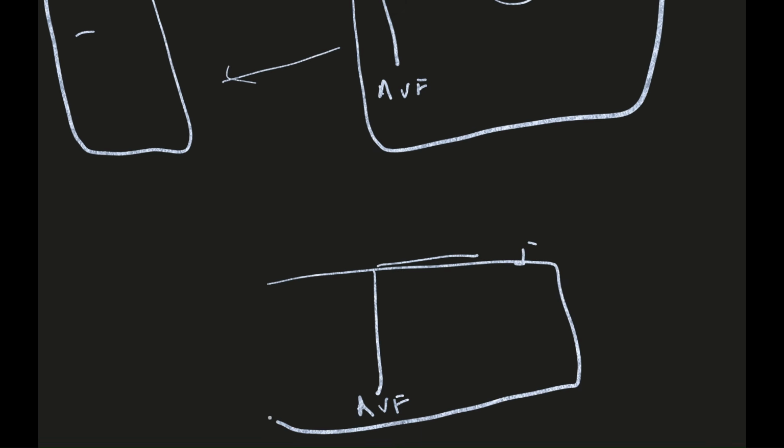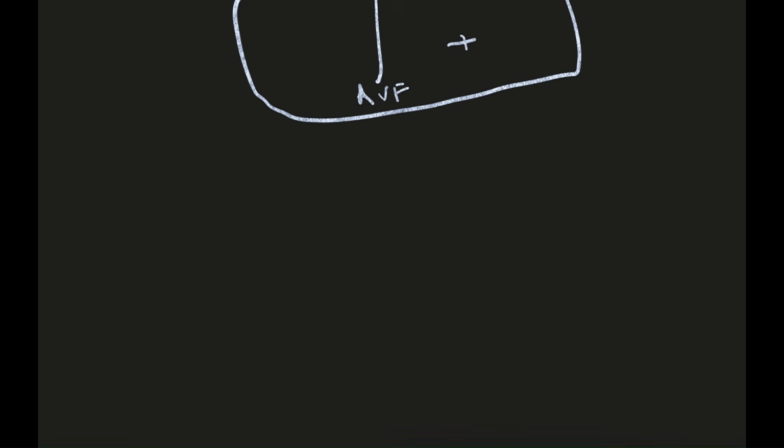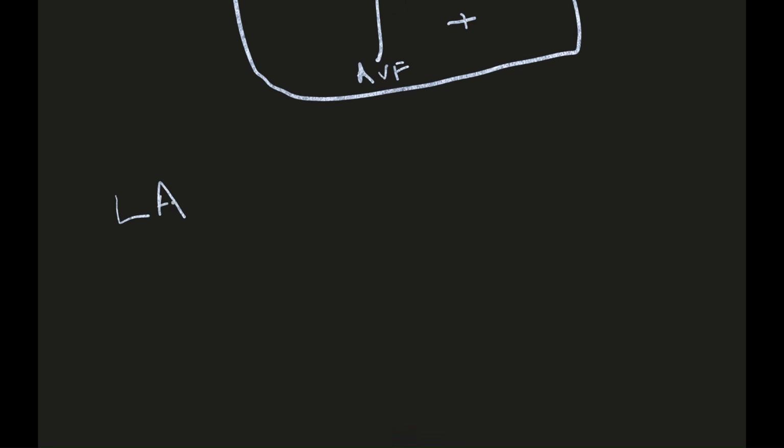This area of AVF is positive. However, this area of AVF is negative. What happens in left axis deviation? This is your lead.